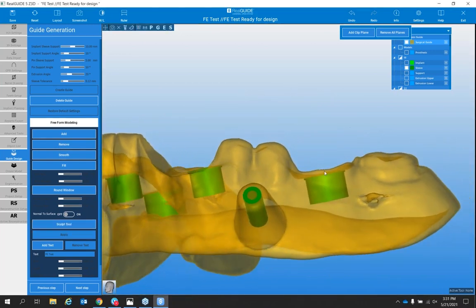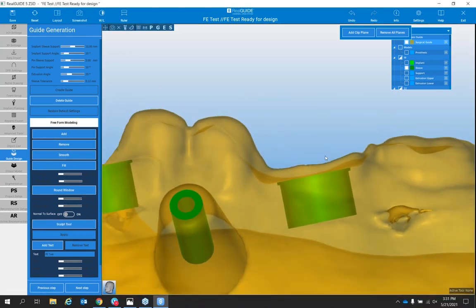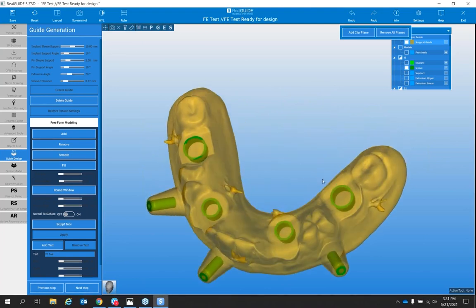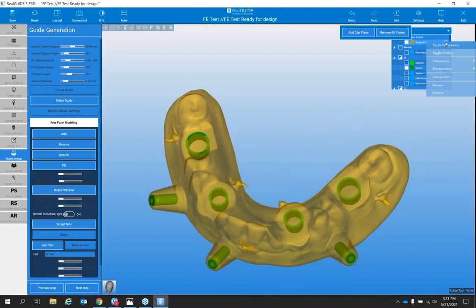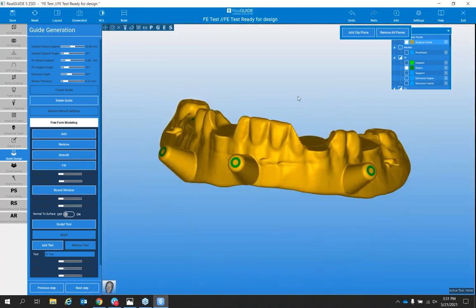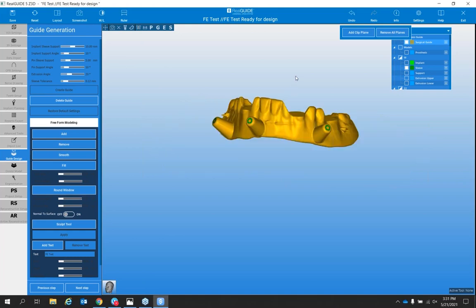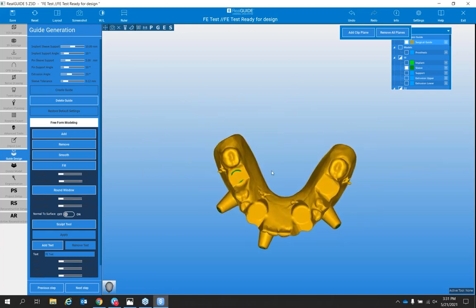And again, here we have some excess here, maybe a little lip there. Perfect. So now we have our, I'll make this untransparent. So now we do have our surgical guide, still using the denture's teeth. That way, once you do place the surgical guide, you have those teeth to find home, know exactly where this denture is seated.